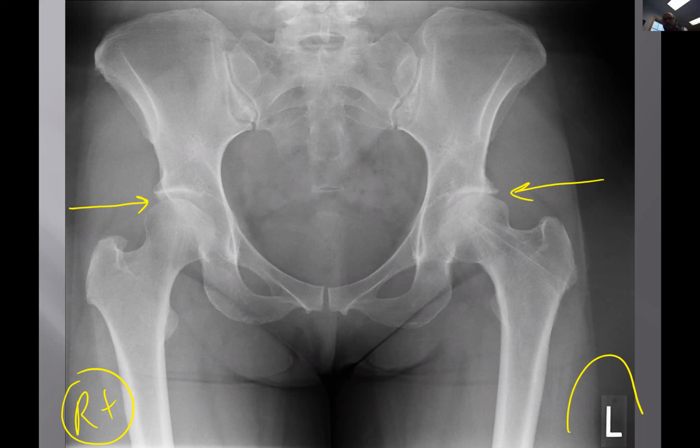In that left hip. Would you call that an impingement too, with a cam and maybe a little pincer impingement? Well, I probably would question it because if you look here, do you agree that it's a little more bumpy there? Yeah. A little more prominent there, and also there's quite a bit of overhanging. So I would clinically correlate for femoral acetabular impingement, but not super. Remember, femoral acetabular impingement is a clinical diagnosis. I agree. There's X-ray findings that can correlate, but so maybe minimal connection here. But yeah, I think you could raise that possibility.